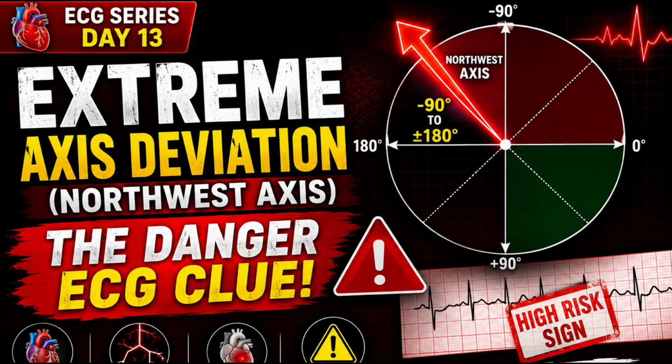So far, we have learned normal cardiac axis, left axis deviation, and right axis deviation. So today, we are going to learn the most abnormal cardiac axis, that is, what we call extreme axis deviation, also known as the northwest axis. This is an important ECG finding because it often indicates serious cardiac disease or life-threatening arrhythmias. So let's understand it step by step. Without wasting time, let's begin.